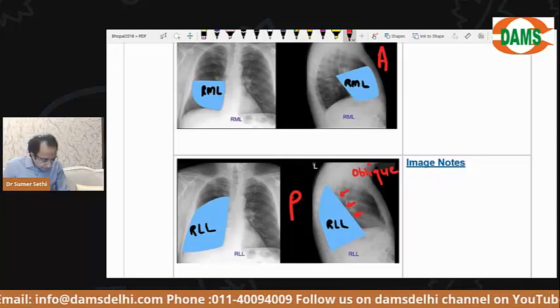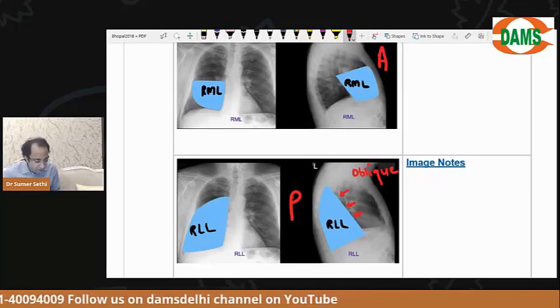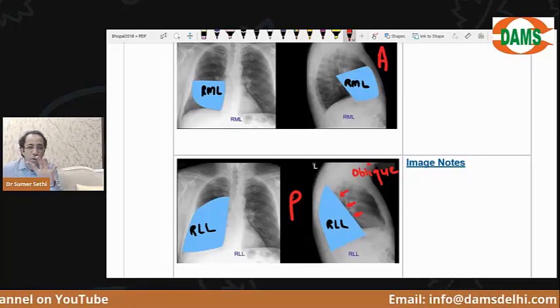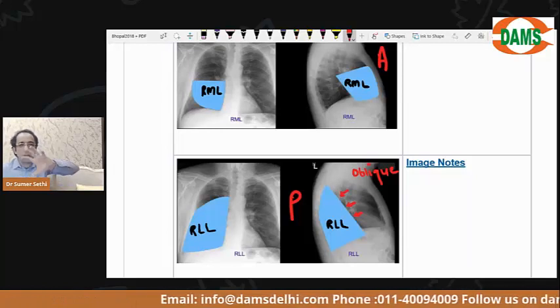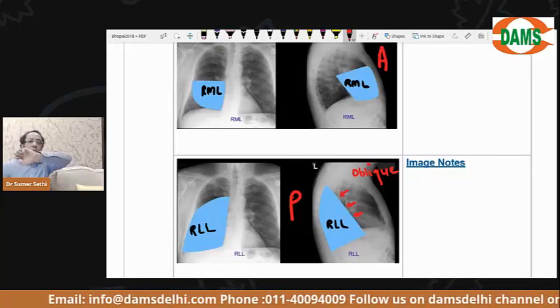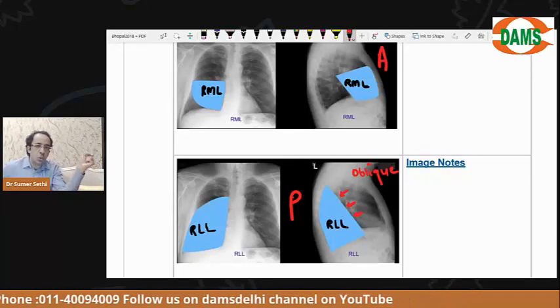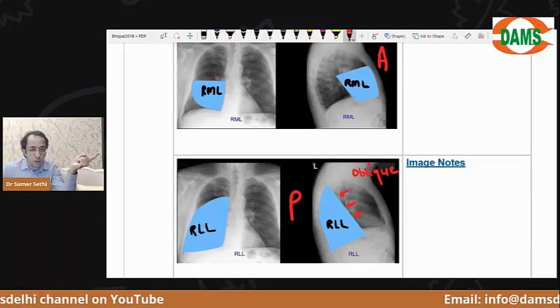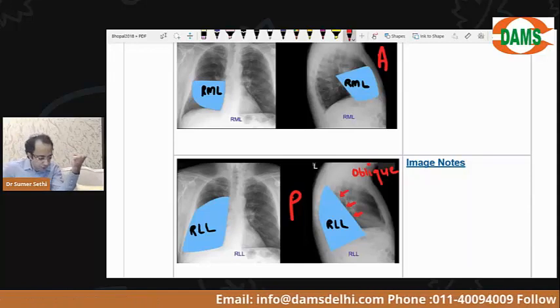Okay. Now somebody is asking fibrosis और consolidation में कैसे फर्क करेंगे? Again बेटा, you need to understand fibrosis. कहीं पे भी बेटा fibrosis होगा, क्या करता है fibrosis? Fibrosis का shrinking. So that lobe will become small and it will pull the trachea towards it. So fibrosis will lead to collapse. It is called cicatrisation collapse of the lobe. Do you understand? जहां fibrosis होगा, चीजें shrink हो जाएंगी, छोटी हो जाएंगी.